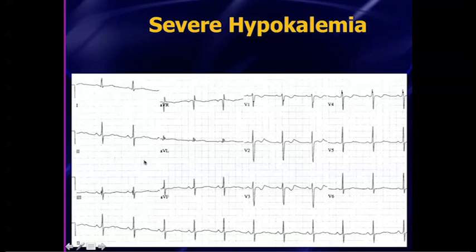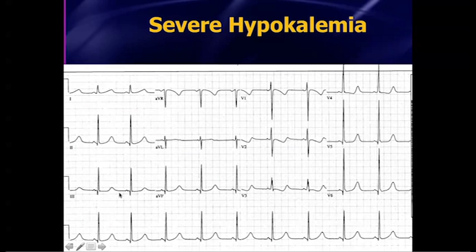Here's another case. Once again, T-wave goes down, and then you've got a big U-wave jumping north, upward into the sky. So it's a reverse Wellens wave. That's a big U wave right there. That's your U wave. And out here in the limb leads, you just get a lot of T-wave flattening or a really long QT interval. All right.